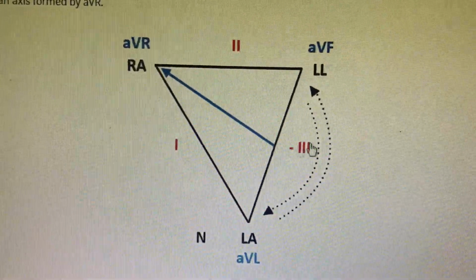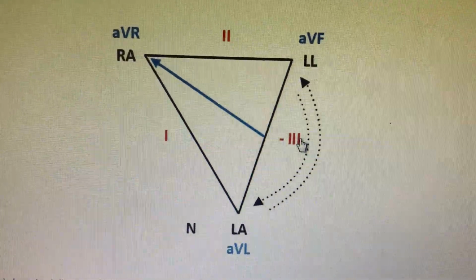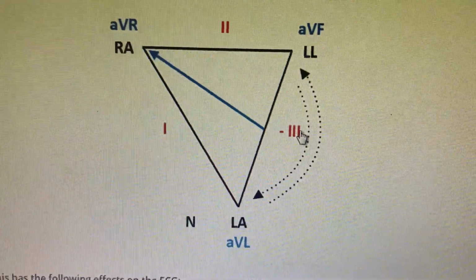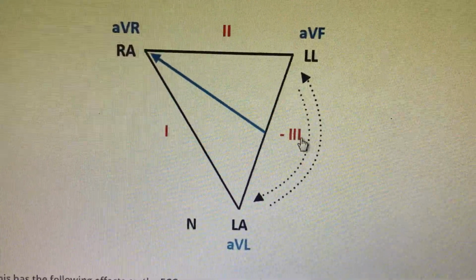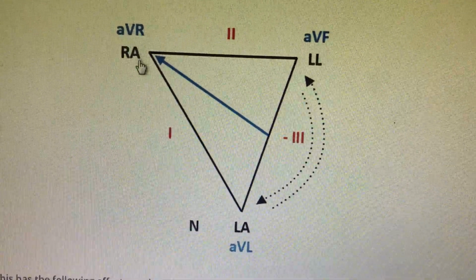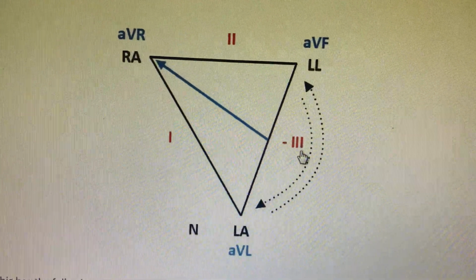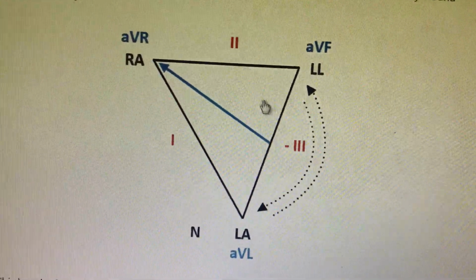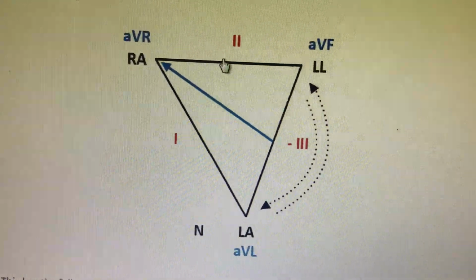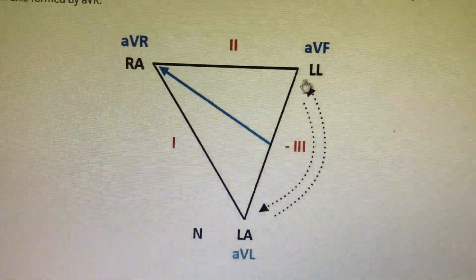See, this type of ECG you usually come across very often. For me, I feel that this is the most common type of lead misplacement we have seen. Many times you can see that lead 3 is the isolated lead which is inverted, and AVR, obviously, will be inverted in all normal ECGs. But you have seen many ECGs where lead 3 is inverted, and many call it inferior ischemia, because lead 2 is not that prominent, because lead 2 is appearing as lead 1, and AVF and AVL are getting swapped, like AVF is becoming AVL and AVL is becoming AVF.